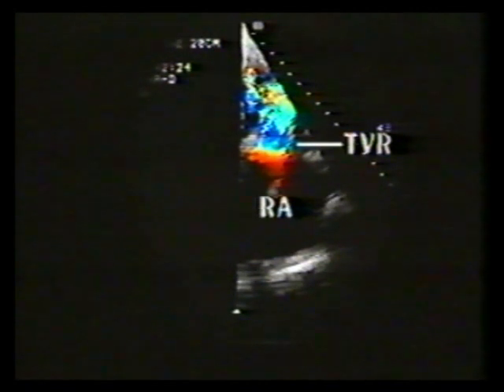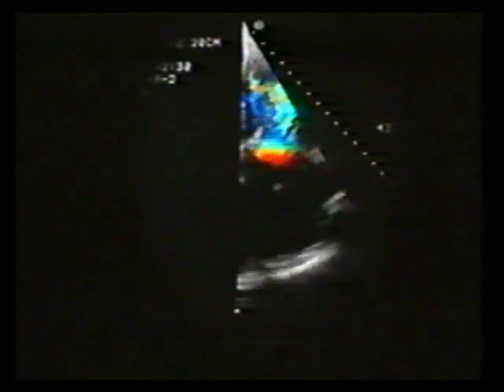This 73-year-old male also has a tricuspid heterograft prosthesis. The color flow image in diastole is identical to that of mild tricuspid stenosis, with a central blue zone representing color aliasing. This is due to the small gradient created by the prosthesis. Incidentally noted is trivial regurgitation across the valve. The right atrium is moderately enlarged without thrombus.